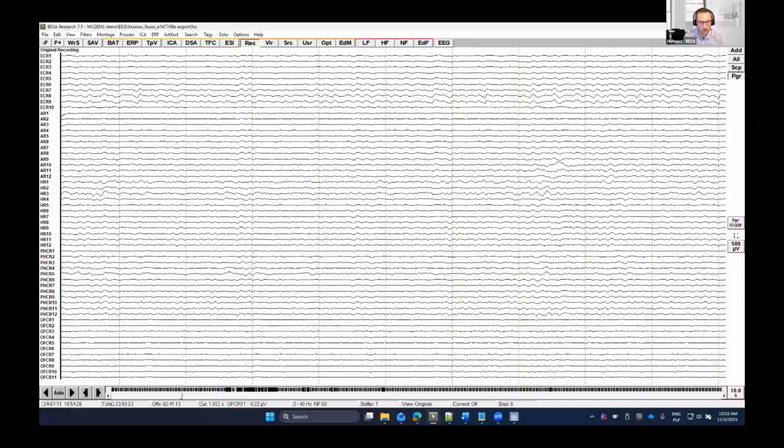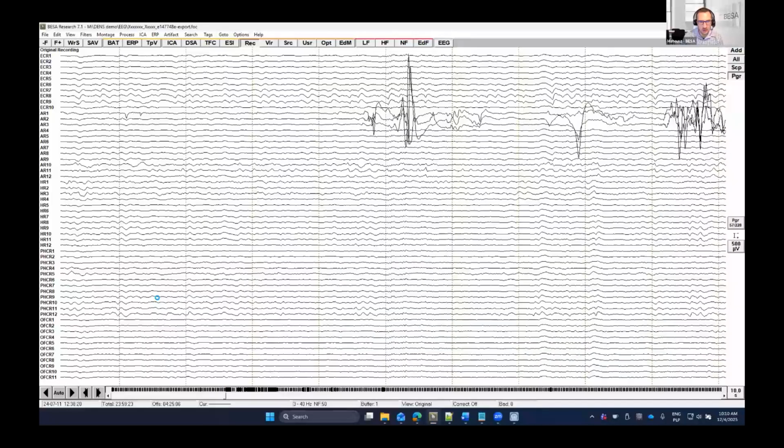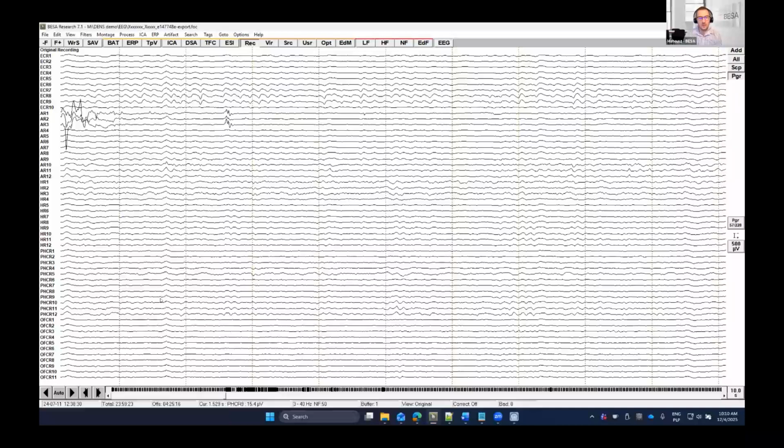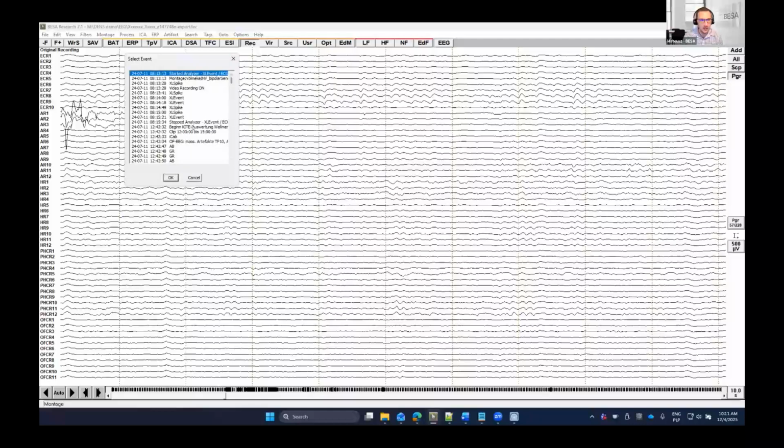However, we have a 23-hour recording and a lot of channels. So processing this data will take quite a while. And if you are in such a case, you have a long recording and you know that you can trim your results to the given time span, you can do it to not perform the search over the entire data set. I will show you how to do it. We go to the event log, and in our case, we have the start marker here somewhere later. Let me look for it. Where is the start? Here, begin.